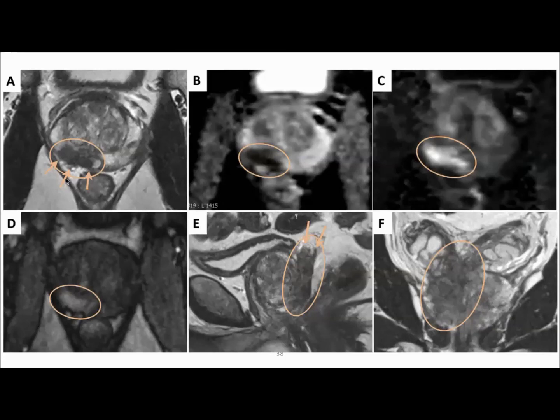And if we see the contralateral side, we can see the capsular margin very well, but as shown by these arrows, we can see the irregularity around the capsular margins, which is very suspicious for capsular breach. This lesion definitely looks bigger in size, most likely bigger than 15 millimeters. So this lesion has to be characterized, based on the 3 sequences that I have described, as a category 5 lesion.